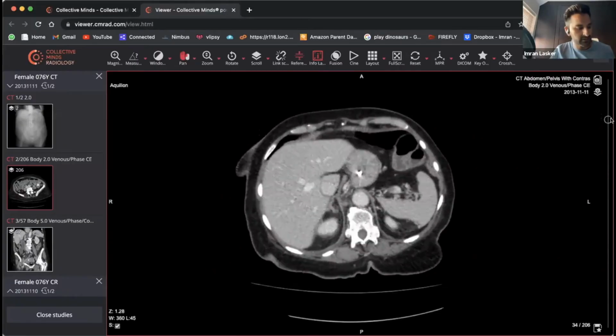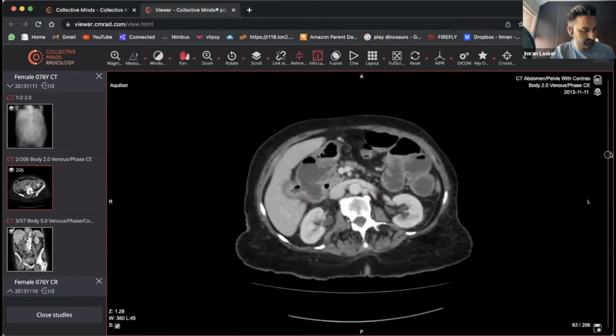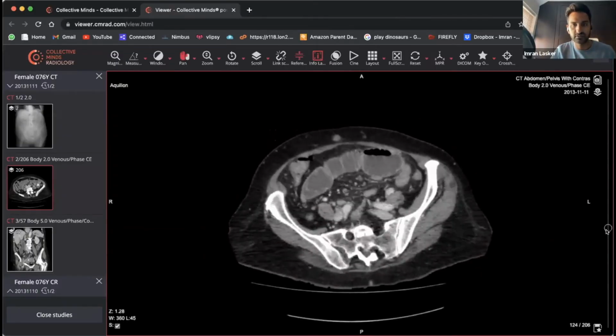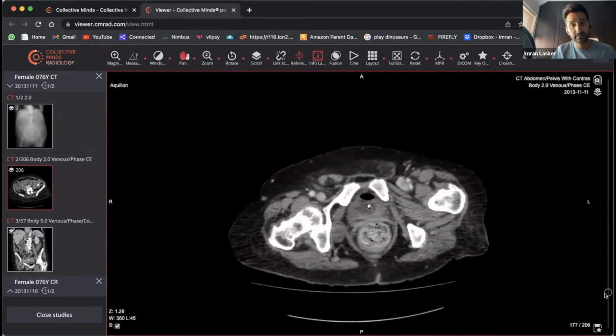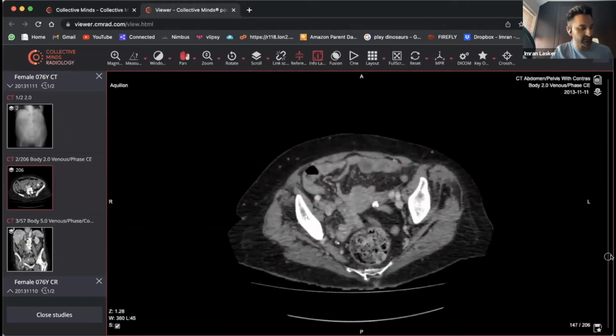Like this. Keep going, all the way down. And then, for those of you that may see it, great. If you haven't, don't worry. We're going to go through it anyway in a very systematic manner.